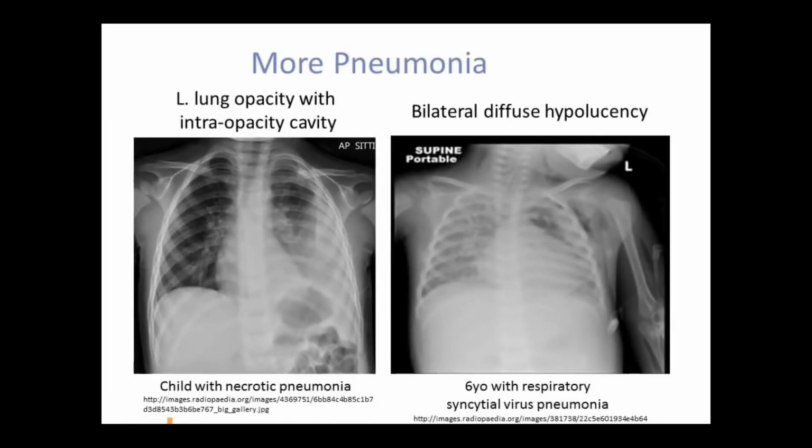The subsequent patient is a 5-year-old, again coming in with a fever and a cough. However, this X-ray looks a little bit different from our previous one. Let's walk through the steps again. This film is again well penetrated, 8 to 9 posterior ribs are visualized, and the clavicles are equidistant from the spinous process. The thymus is not visualized in this film and there are no obvious masses present.